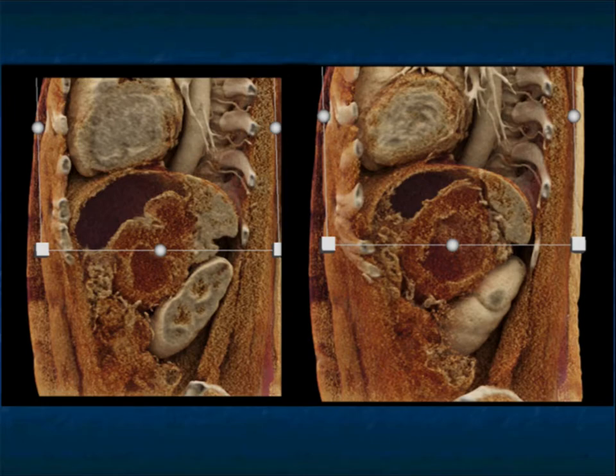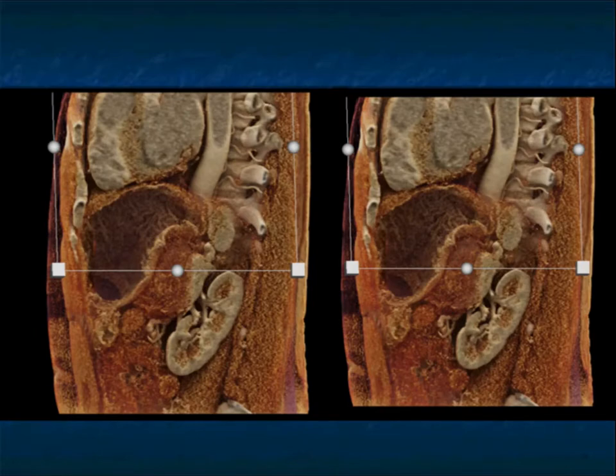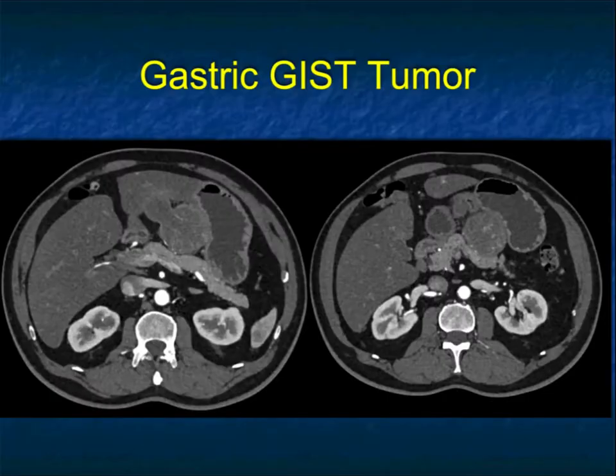Again, sagittal view very nicely can be helpful in this regard as well. And again, look at the sagittal, how you can see the tumor, the changes on the posterior gastric wall, and the exophytic nature of the mass. Now, I've mentioned and I've shown you exophytic lesions that are large. I showed you in the beginning, in part 1 of the talk, some that weren't as large.